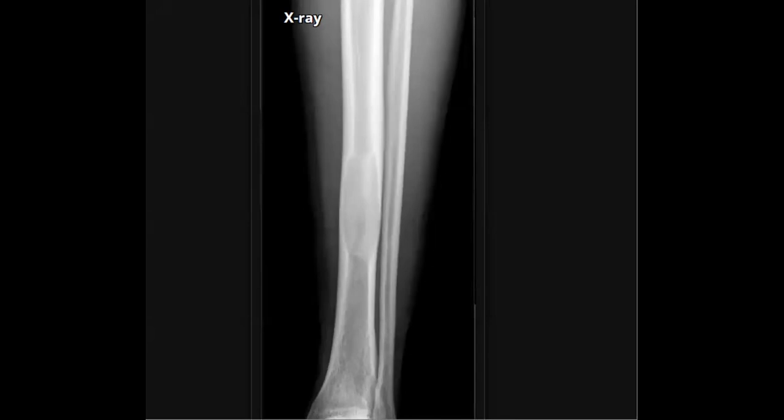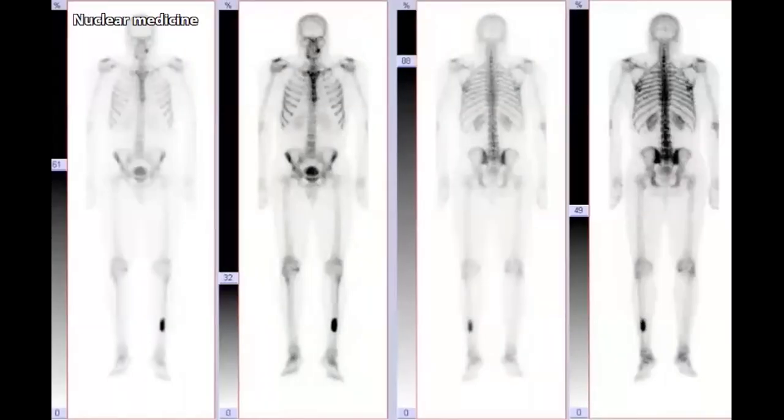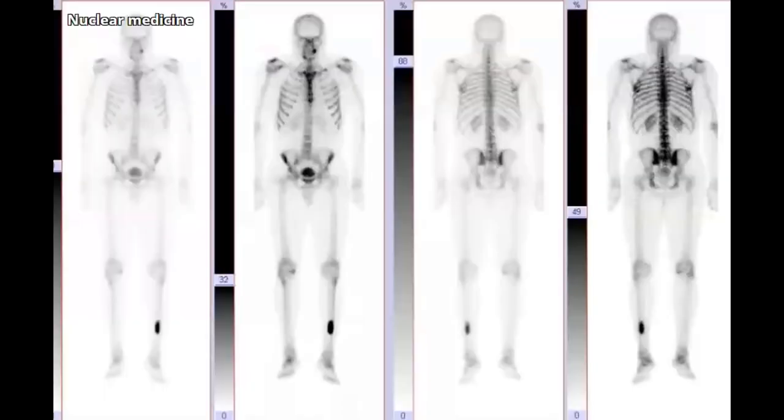This means that if you see a bone scan and you have uptake, don't think about just metastasis. Don't think about aggressive lesion. It can be a benign lesion. Some benign lesions can have uptake. And there is something good to know in fibrous dysplasia in such a case: you can say whether this fibrous dysplasia is monostotic or polyostotic. What do you think? Was it monostotic or polyostotic? What do you think? Yes. If it is polyostotic, as you know, it will be another differential and other syndromes.